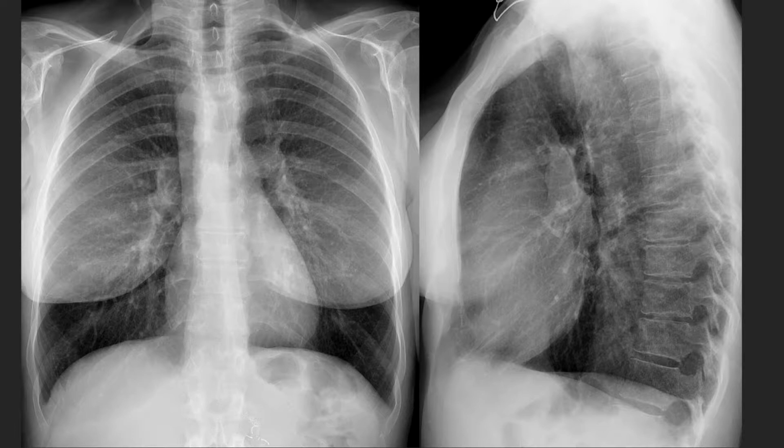This is because the right-sided aortic arches are typically associated with an aberrant left subclavian artery. This has a course that's both posterior to the trachea and the esophagus. Because it's horizontally oriented, it's going to appear as a circle on the lateral view. In addition, for congenital reasons, these aberrant subclavian arteries can become dilated, which can then push on the trachea and esophagus, potentially producing symptoms.